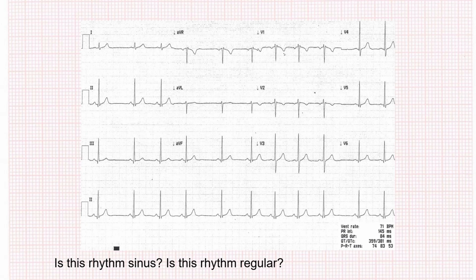So let's take an EKG, for example. Is this a sinus rhythm? Well, just visually inspecting it by stepping back, you can see that there is irregularity present. The 3rd, 4th, and 5th beats, which are also present in the rhythm strip at the bottom, look like a regular uniform P to P interval, regular R to R interval. They look like the same PR interval. They're narrow complex. The P wave is upright in 2.